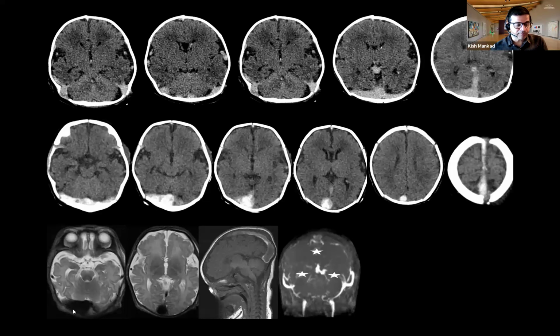But deoxyhemoglobin, because the hemoglobin product in the thrombosed vessel is maturing away, can actually appear quite dark on the MRI scans, and that doesn't help you because you think it is flowing, but actually it is thrombosed. And then you also look at the MR venogram, and there is lack of flow in multiple areas.